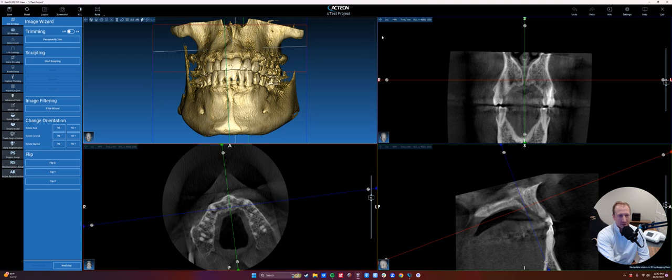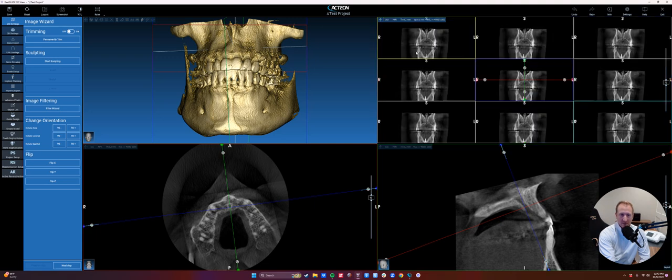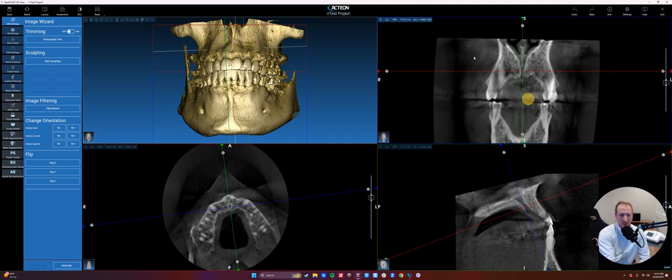There are also slices next door in the toolbar that says 1-to-1. These are different viewing panel option layouts for the individual panels. So not just the layout button for the general layout, but you can even change the layout for these individual panels. Okay, and that might come into play more when we do some implant planning. For now, we'll leave it at 1-to-1.